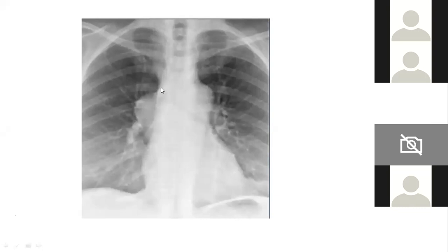It's a mediastinal lesion based on the findings of obtuse angle, broad base towards the mediastinum, smooth margins, and we can see that there is a widening of the carina. Someone pointed out that it was a bronchogenic cyst. See that it is not silhouetting the cardia, right? It is not silhouetting even the ascending limb of the arch of aorta as of now, right? But definitely the subcarinal angle is widened.